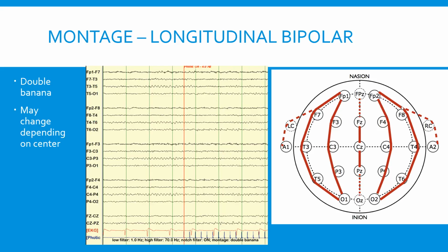Do you see it? FP2, F8, right? Just look at the first one, FP2, F8, you can see it's on this side. So left and right. The way this is set up is very convenient for us to compare the left versus the right. Okay, so this is a left temporal, this is a right temporal, and now moving on.